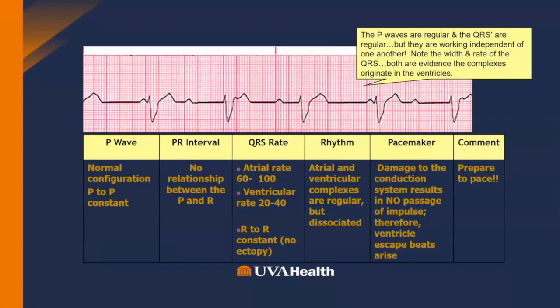And what do we see? This is probably the easier rhythm to discern, because if you know what you're looking for, then let's take a look at P waves. We have a constant P. There's a P wave here, which you don't see, but you have to kind of envision it happening because you have another one here, you have one here, and you have one here. You don't always see these.